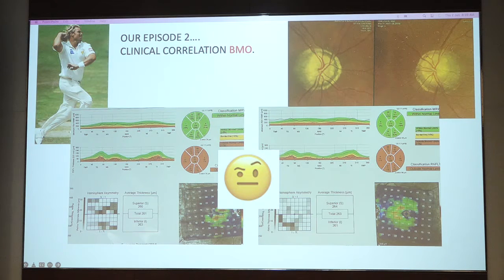Okay, fine. So, is this glaucoma? Is the question. Now, here is where we look at the case in toto. This case was referred to me by somebody. Now, what I didn't tell you is, this patient had pressures of around 30 for the last 6 months, and the patient was not being treated because the cup disc ratio was 0.3, because the person treating was not a glaucoma specialist. Now, because it was 30, he said, no, but he had a classical Bjerrum scotoma. But no, disc is normal, so it may be ocular hypertension. What he did not realize is that this is full of disc drusen.